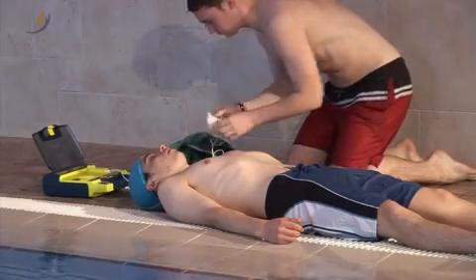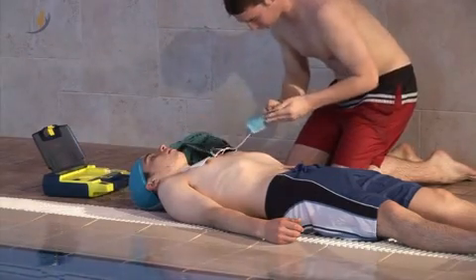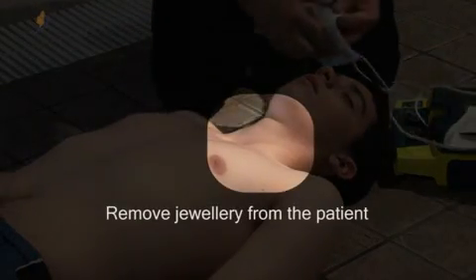AED Special Situations. Using an AED requires awareness of some special issues, so you can take appropriate action and precautions. There are special issues to be aware of when using an AED.